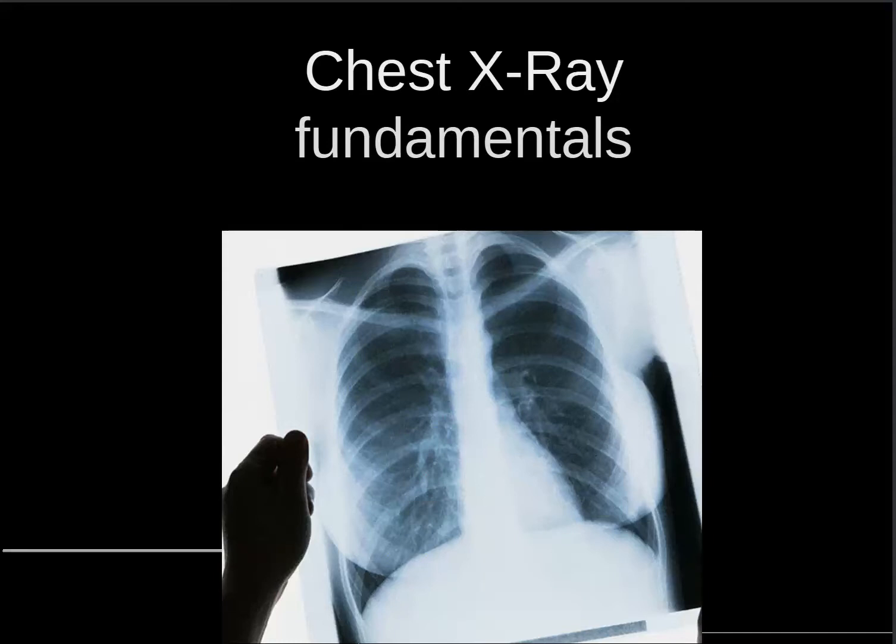The X-rays go through the patient, and if they go through less dense tissue, the impression or the shadow they make is dark. If they go through denser tissue, such as soft tissues, heart, skin, they become a bit more grey. If they go through very dense tissue, such as bone, the shadow they make is white. So when you look at this chest X-ray, you can see that the air in the lungs is dark, the ribs and the bones are white, and the mediastinum is also white.